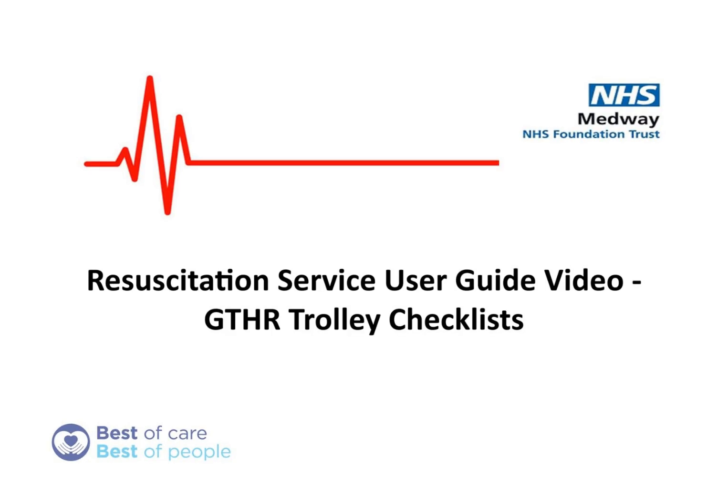Hello, and welcome to this Resuscitation Service User Guide video on how to access and use the Gather audit system for performing both the daily and weekly cardiac arrest trolley checks.